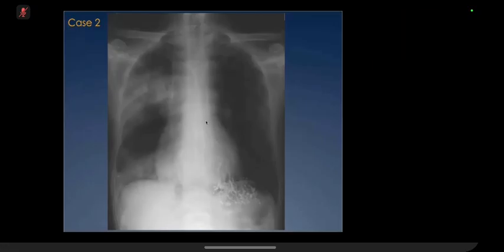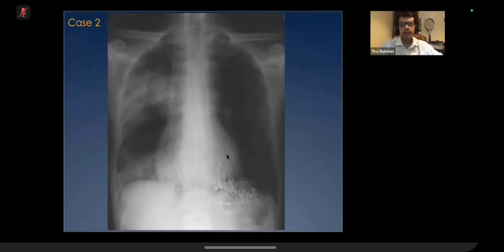So maybe the esophageal stent is blocked and the patient has aspirated and become infected, and is getting IV antibiotics via the central line. Put everything together now. In your GI postings or barium postings, you do get referrals for looking at patency of esophageal stents. Somebody did a barium study, and the barium did not go into the stomach through the esophagus; it got aspirated because the stent is malfunctioning. So that's the diagnosis in this X-ray.